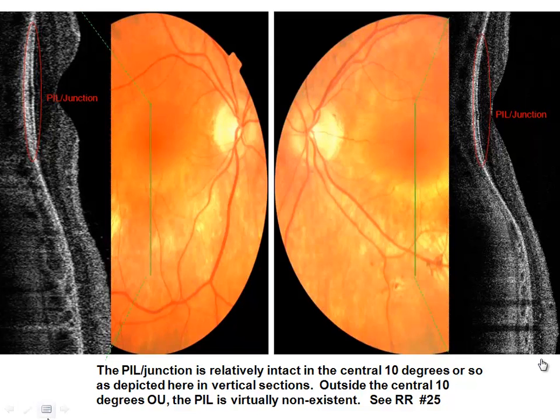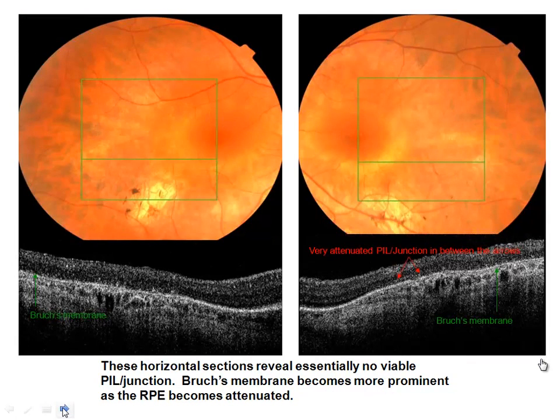And this is actually a form of retinitis pigmentosa. This is sort of like a pericentral retinitis pigmentosa. We actually know the gene and so on, and it's an autosomal dominant, runs in the family.